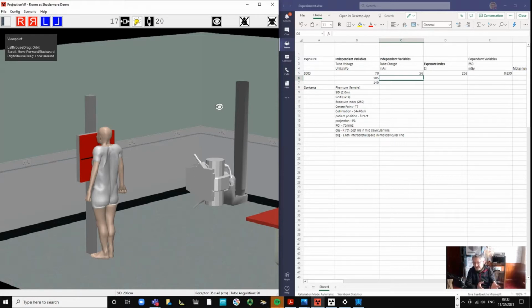Do you see what we've done in half an hour? We've made our first exposure, and maybe we spent half an hour, we've spent an hour. So we spent an hour last week, an hour the week before, and half an hour so far, and already, so 3 hours work, we could have all of the data to write up one of these papers, couldn't we?